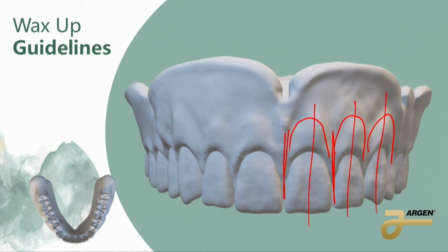Same here. We don't want a huge divot right there in the wax, which we see a lot in these big, beautiful wax ups. It's a big divot in the upper because it looks cool. It looks like a piece of art. This needs to be functional. We're not displaying these on walls. We're putting these in people's mouths. And if you start to really look at tissue, if you're looking at these crown and bridge photos where they're pulling back and you see the teeth, look at the gums and just look how natural tissue looks.